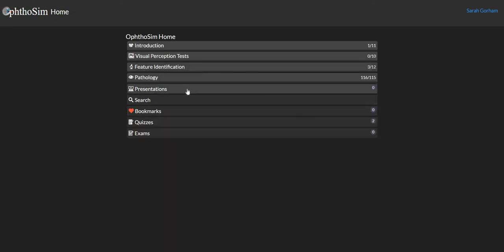Again, students can find presentations and quizzes and exams here that you have customized or deployed to them, and it's built out the exact same way as the OtoSim, so once you learn one, you really have learned both of them. As a student and as an educator, they are very intuitive and easy to navigate. And it's really just simple to have one platform and one login that allows students access to two really great fully built out curriculums, as well as to implement testing on the education side.